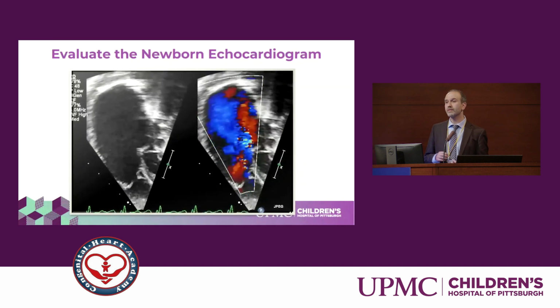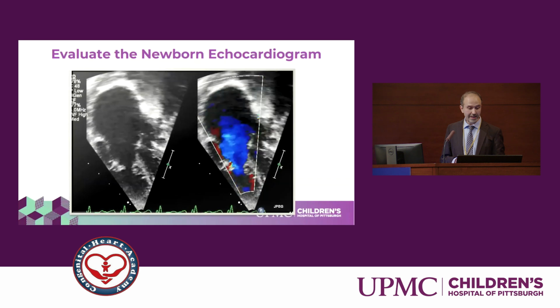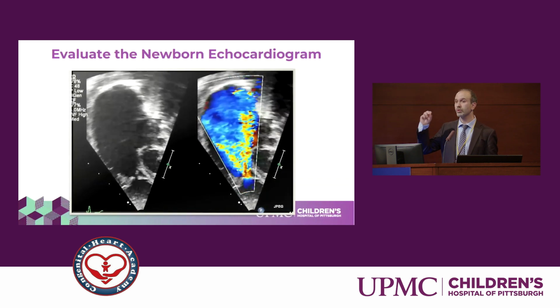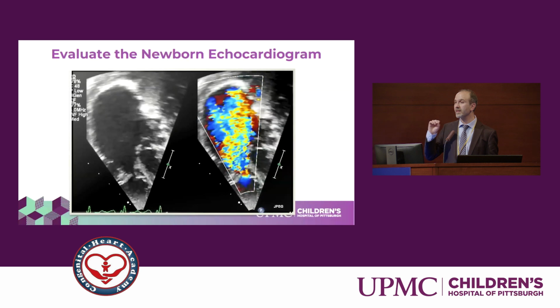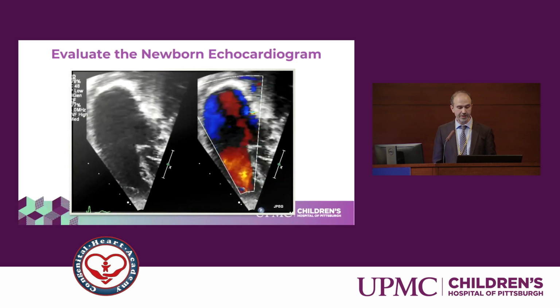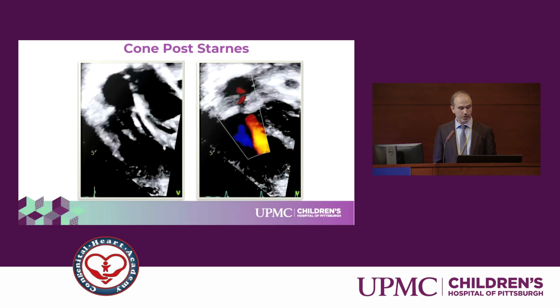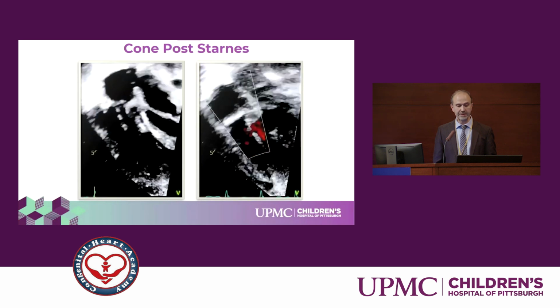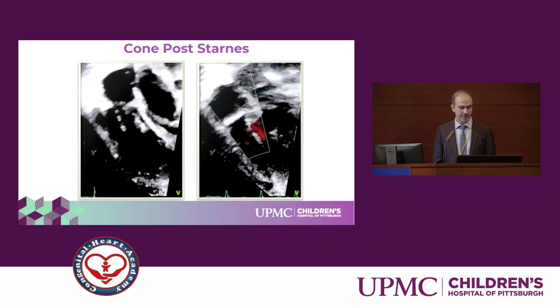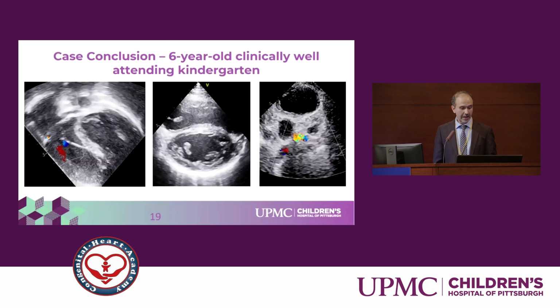Just to emphasize this from an imaging standpoint, it's really important to look at the newborn echocardiogram to evaluate all the anatomical details of the tricuspid valve. And you see, again, this severe tricuspid regurgitation. And that's the post-op result after the Starnes takedown and doing the cone with only trivial tricuspid regurgitation. And we have some long-term follow-up on this patient.